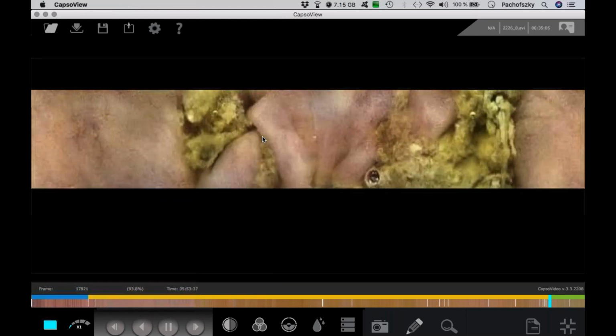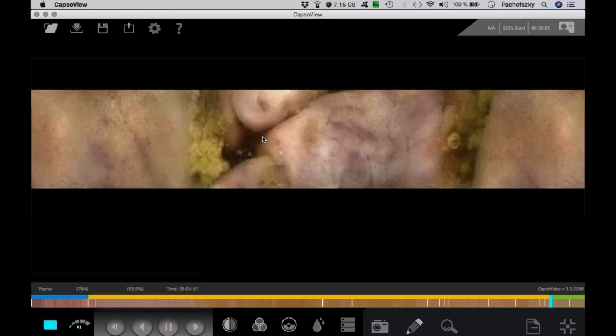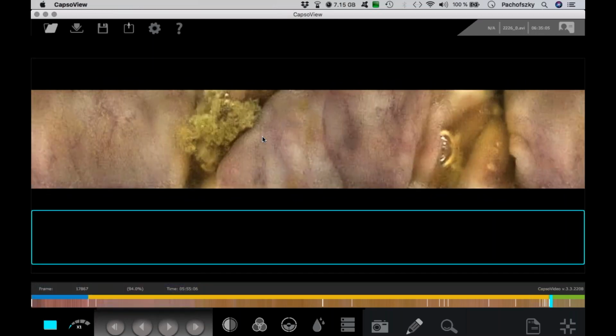It could be a kind of vessel disease, like a morbus Behçet. A TBC in the small bowel can also look like this with a lot of ulcers. So we have some differential diagnoses, but we can't name it only with the capsule endoscopy, with the pictures and without any history of the patient.